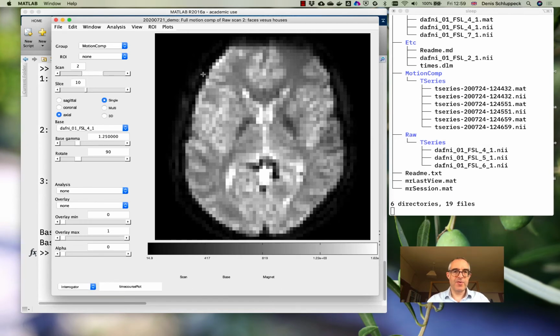Right, so the results of this analysis were actually a bunch of 4D data files, which we can't visualize as statistical maps, but there's this additional data which we can show as line plots. Let me show you another kind of analysis in which we are going to do some dimensionality reduction, in the sense that we're going to calculate some statistic from the 4D images that results in 3D images of statistical maps.